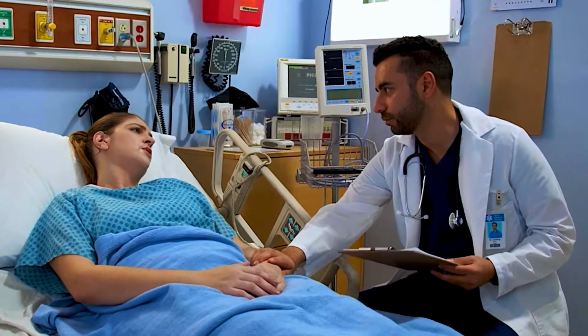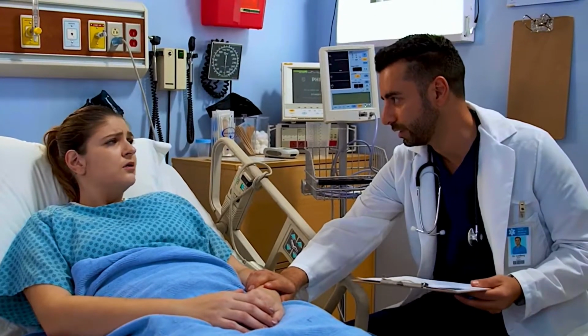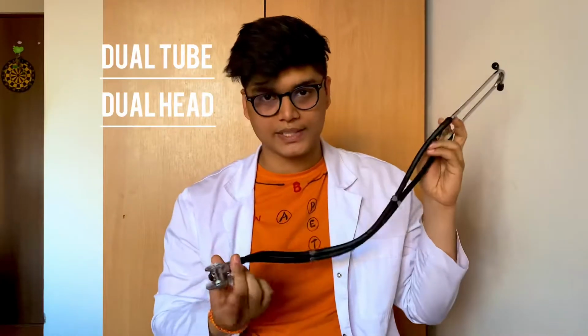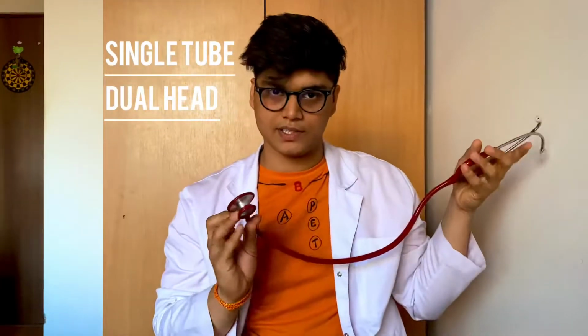When you imagine a doctor, you see a person with white coat and stethoscope around his neck. So it's necessary to know all the peculiarities of stethoscope. First, let's talk about types of stethoscope. This is dual tube dual head stethoscope. This is single tube dual head stethoscope.